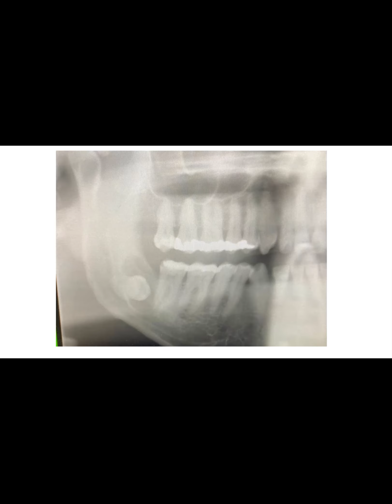Any type of odontogenic cyst? Mention one, please. Sorry? What is the most common thing you would think appears, because you remember when Dr. Ali classified it, he said you look at the location, you look at the age. So over here, what would you look at? It's the angle of the mandible. So what do you think it could be? Keratocyst, wonderful.